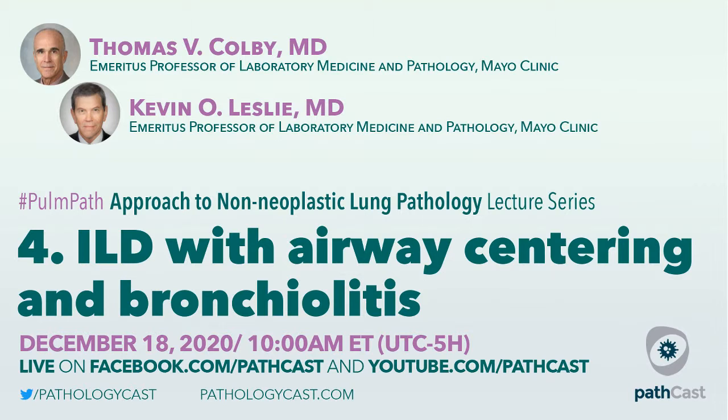Yeah, that's a good question. I think that the net effect may be the same. I presented these as separate things, cellular bronchiolitis and organizing pneumonia, et cetera, but really there's considerable overlap there. I think the key thing is if the observer can recognize this as the bronchiolocentric process, that's the main point right there. And then to exclude other things that we do, like infection, special stains, et cetera, that sort of thing.